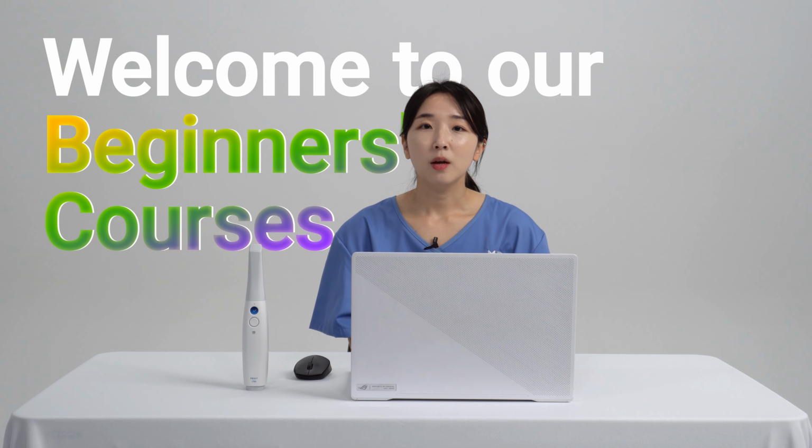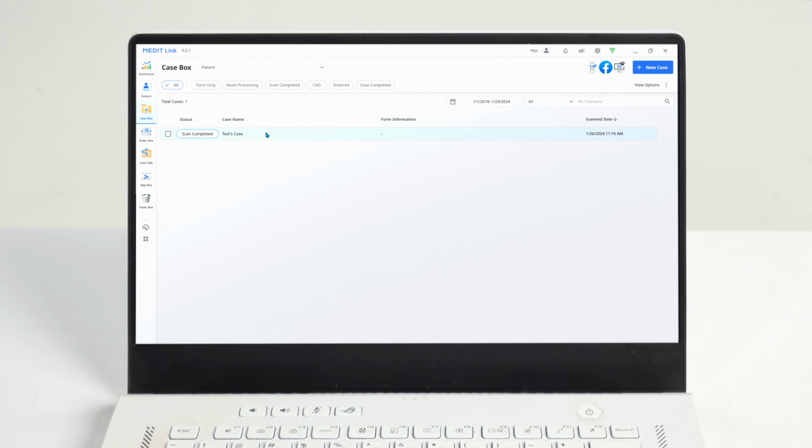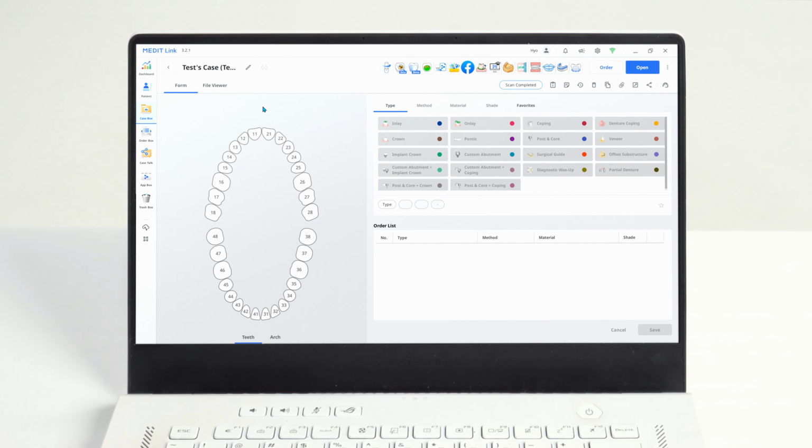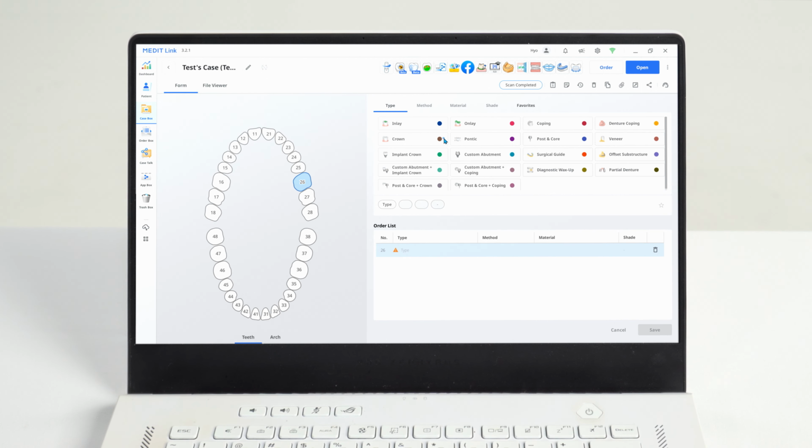I'm Young. Continuing from our last episode, Scan Preparation and Scan, we prepared the final episode, Order. In this video, we're going to show you how to send an order to your lab. Once you're done scanning, let's go to the Form tab. Fill out the form. Select the type and material for your prosthetics.